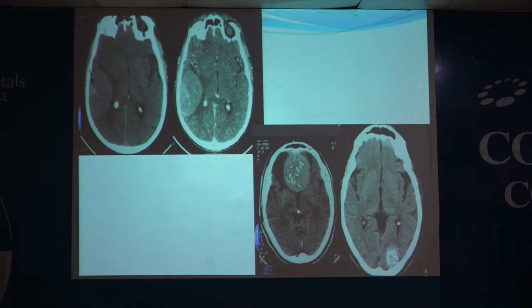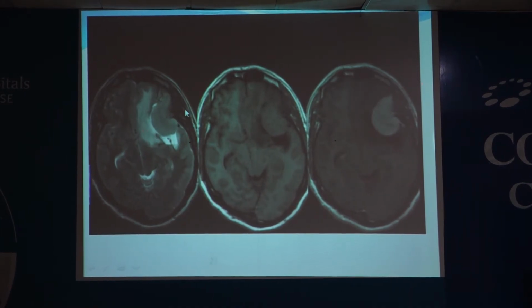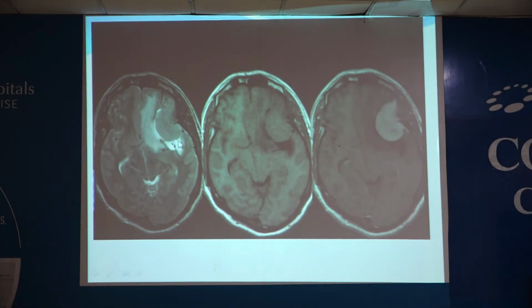This is a meningioma. On MR, an extraaxial mass can have typical features. This is an example of meningioma. This is a T2 sequence, a T1 and a post-contrast sequence, where the lesion is isointense to the gray matter on both T1 and T2. It has a well-defined CSF cleft, with CSF seen around the tumor.